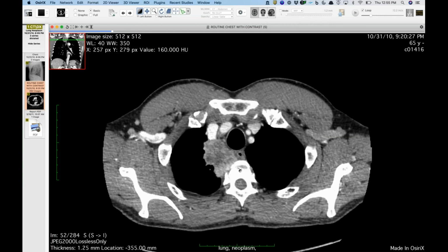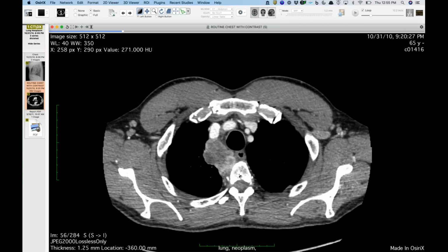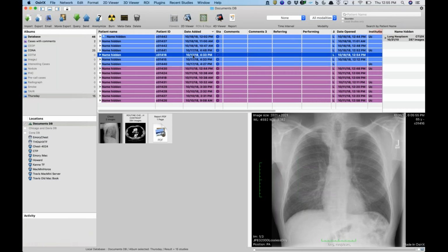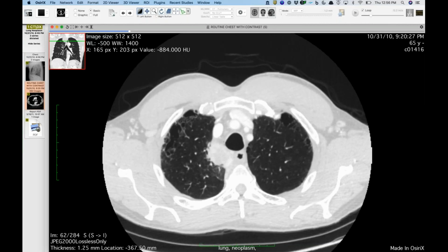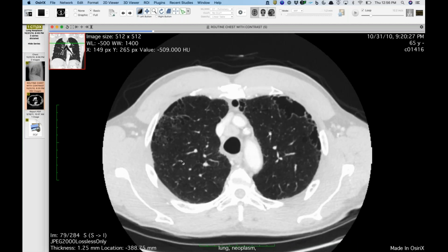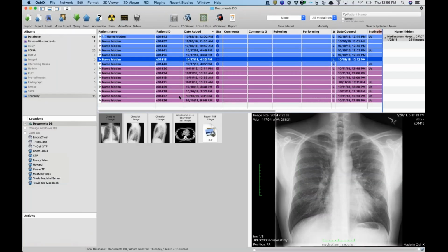Yeah. So it's still a T4 just with the mediastinal invasion anyway, because you can clearly see it's extending behind the trachea. Cigarette smoker or not? I don't know. I'm guessing probably. Did he have on the CT? Let's see. Yep. A little bit of airspace enlargement, fibrosis there, and paraseptal emphysema. So presumably a smoker in that case. It was an adenocarcinoma though, not a squamous.